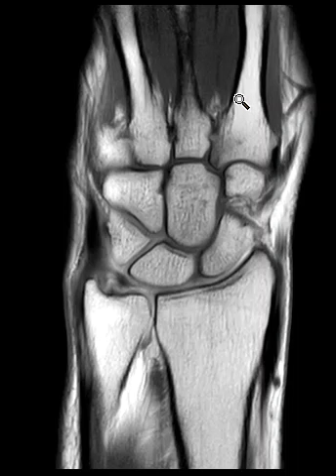Hello, this is Dr. Gay from First Look MRI, and this is a 69-year-old male who had a history of injury several weeks ago, a falling injury. Now has wrist pain, most pronounced on the ulnar side.